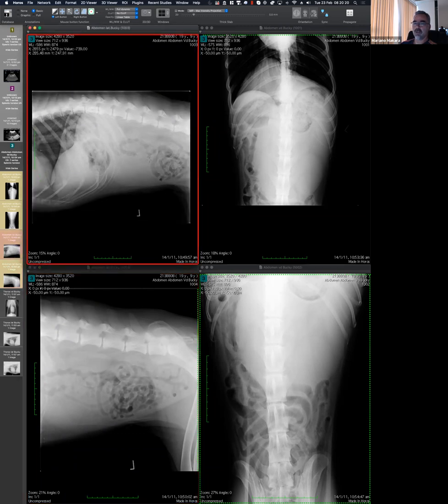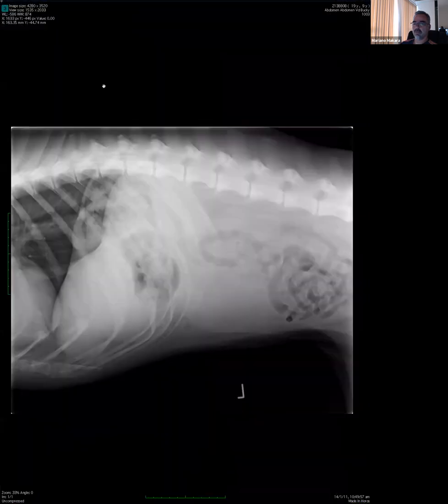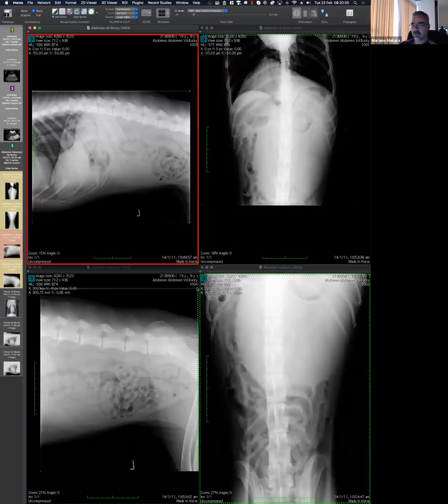If you give me only this projection without the other one, I'm not sure I would call it even a mass effect, probably a little bit here, but it's not as clear. Anyone want to comment about that, or offer an explanation?